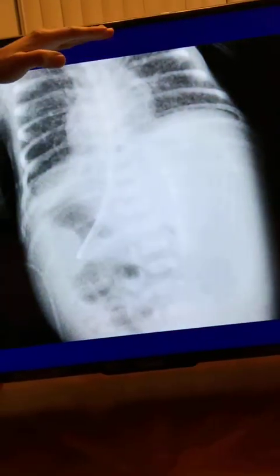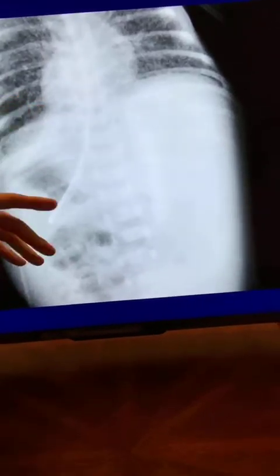So where was I? I just went on this crazy tangent. Oh, we were talking about Rigler's sign. And then I put up Case of the Day Part 2 today, and I gave you another KUB. It was actually a babygram, if anybody looked at my video last time. Let me pull it up so I can refresh your memory here. Well, I kind of truncated it here, but the image originally went way up there and way down there, and I told you that on adult patients, you're never going to see it go that high unless it's a scout film.